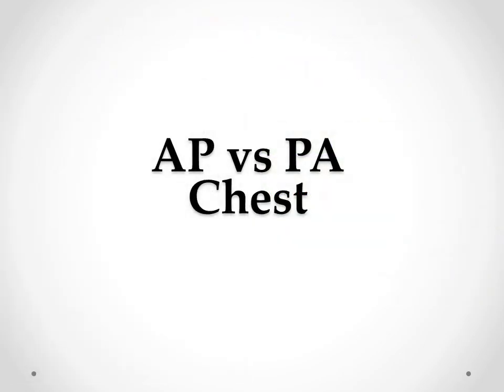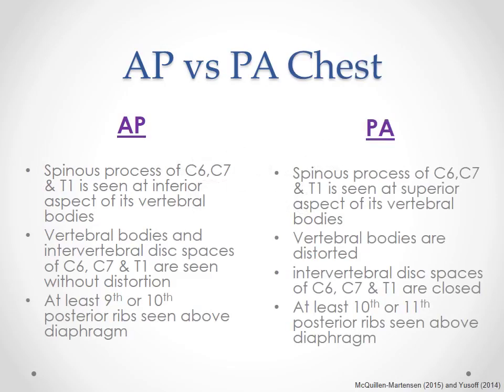Next, let's learn how to differentiate between AP and PA chest radiograph. In AP chest X-ray, the spinous process of C6, C7 and T1 is seen at the inferior aspect of its vertebral bodies. Whereas, for the PA chest X-ray, the spinous process of C6, C7 and T1 will be seen at the superior aspect of its vertebral body.